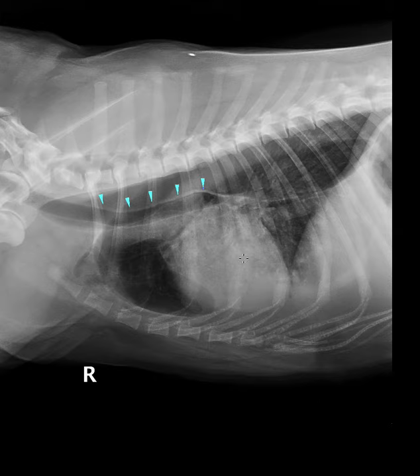The esophageal stripe sign, which I've delineated here with the blue arrows, is essentially a summation of the soft tissues of the ventral wall of the esophagus and the dorsal wall of the trachea. The stripe shows up really well because here we have soft tissue opacity in both of the walls, outlined or contrasted by a different opacity, which is gas. So ventrally, it's well delineated by gas within the trachea, and dorsally, it's well delineated by gas within the esophagus.